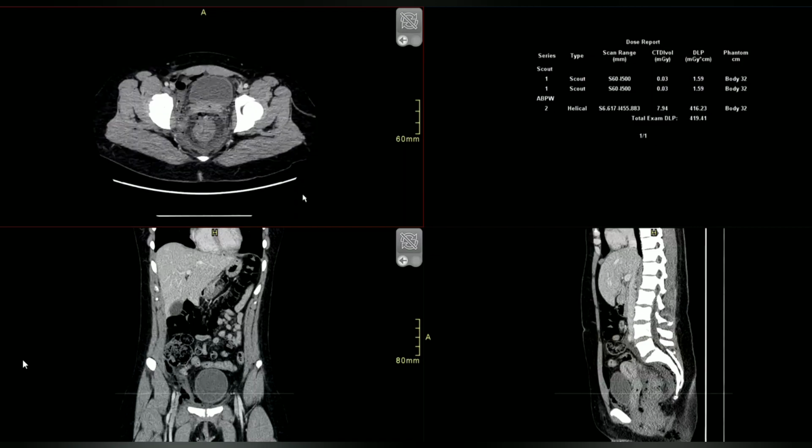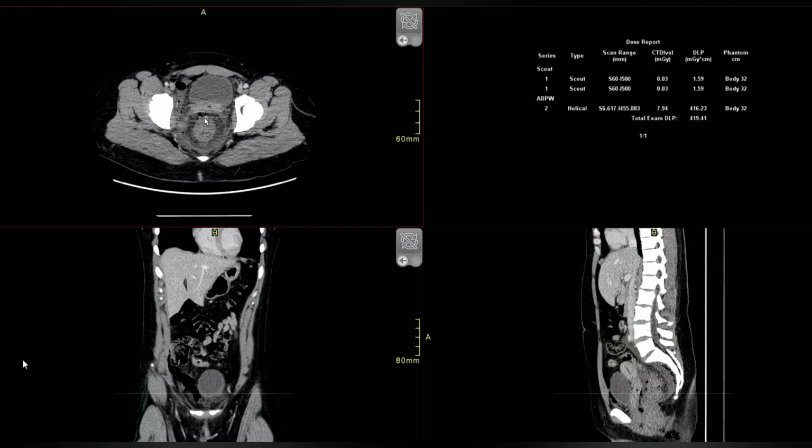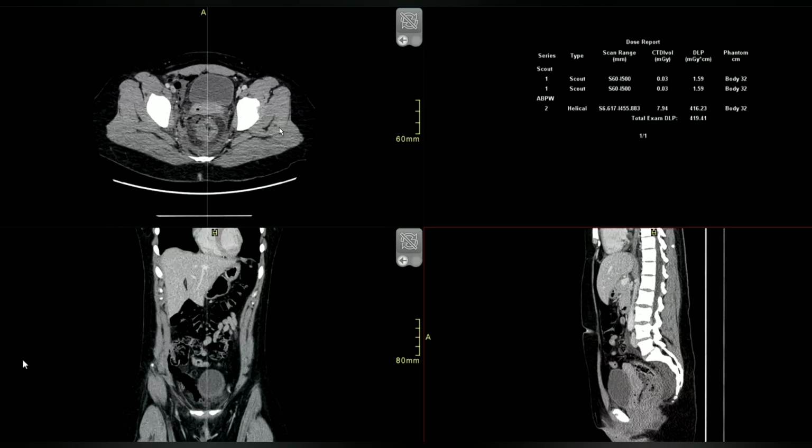I suspect that there is a perforation in the rectal wall. Okay. And there is a diffuse thickening and enhancement also present in the rectum. Okay, free air also seen within the uterus. So what would you be thinking? What would be the cause? I'm suspecting that there might have been some rectouterine fistula developed secondary to some infective or inflammatory pathology, primarily of the rectum.